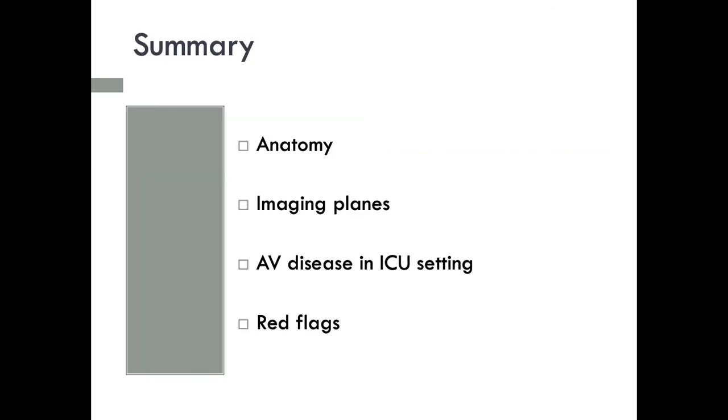So in summary, we've covered the anatomy, we've covered the imaging planes for aortic valve studies, what kind of things we're looking for and might see in the intensive care setting, and have summarised the red flags that should prompt referral for a formal scan.